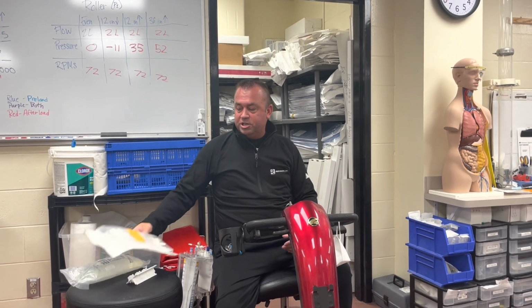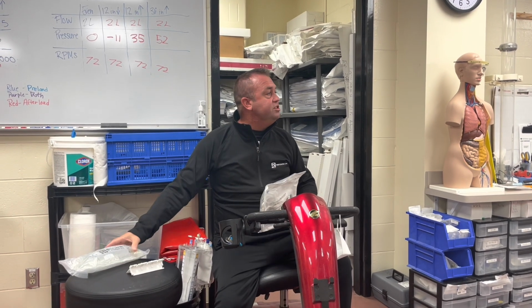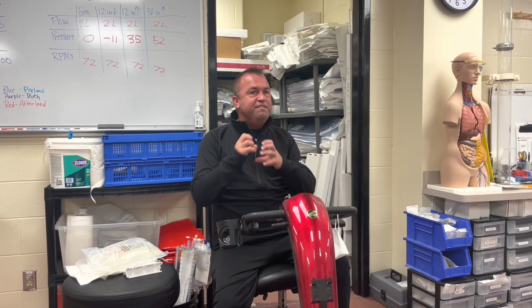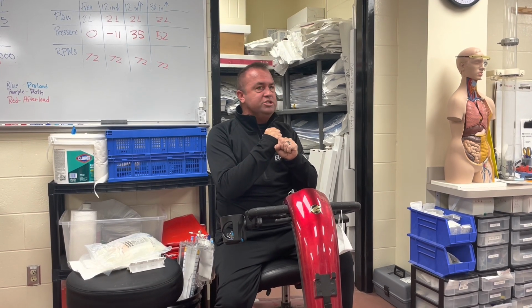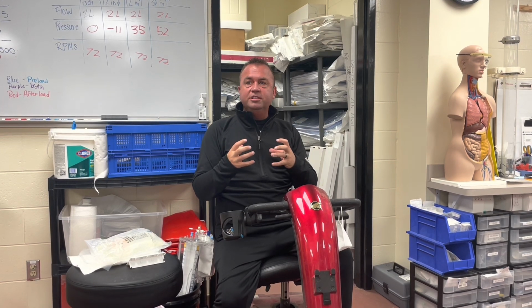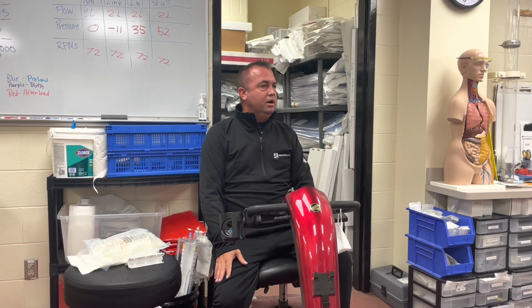Another thing that dampens the pressure in a vessel, or in the vasculature, would be giving too much phenylephrine, or some kind of vascular issue, where the vessel itself becomes either too elastic or so constricted that we don't get a good pressure measurement. Sometimes coming off bypass, not having volume in the patient over a period of time, especially smaller vessels, get dampened. So once you fill the patient back up, the waveform gets less and less dampened. And we'll talk about that and show that later on, and you'll be able to see that.